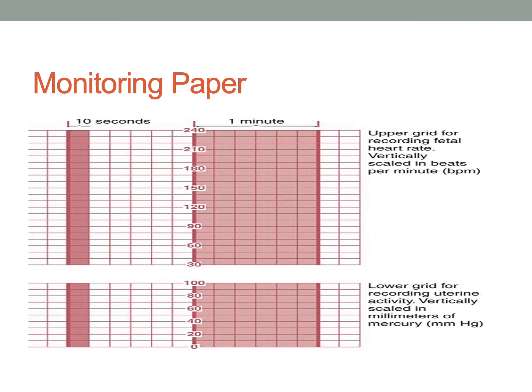When we're looking at contractions, if your contraction starts here where we can see that 0, and then it goes all the way up and it peaks and then it comes back down by the time it's at the other bolded line, it means the duration of your contraction was 1 minute.